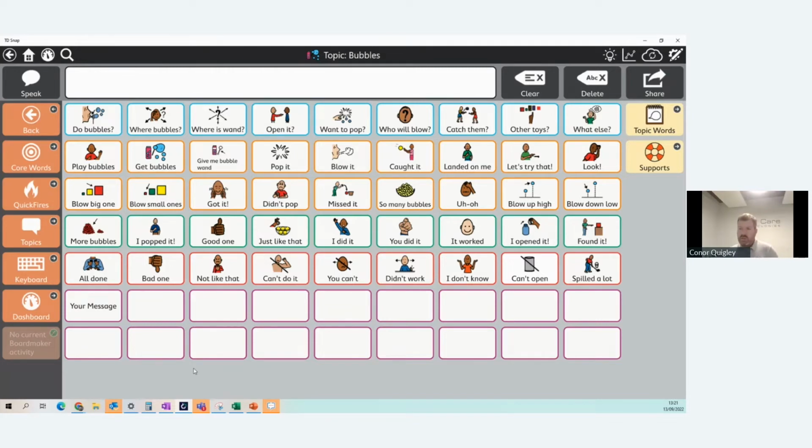Look, this color coding is more for organization than anything. It's not the end of the world if you don't keep to that. You know who you're working with and you know how they react to the color coding. So if you want to keep it: questions in blue, general comments in orange, positives in green, negatives in red, and your custom comments in purple.